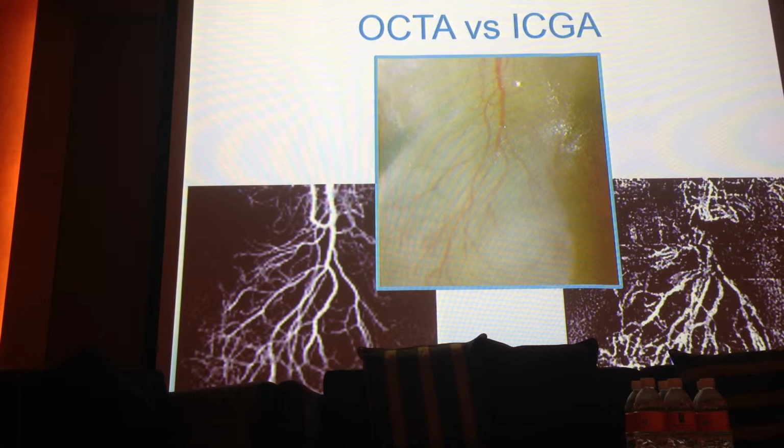So I have another image which I didn't show here. I think. Oh, I do. I'm going to show it here. The next slide where it's gone. But I just wanted to find out what Giovanni, what do you think? I know this is far away from the retina, but some leakage over there, but it's not a scar. No scar. It's very superficial.